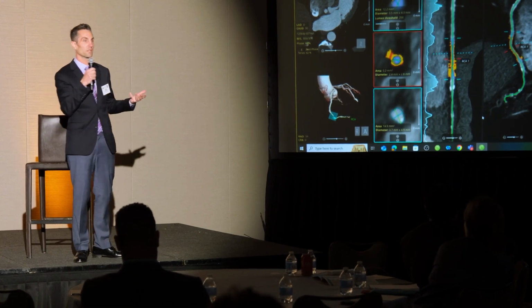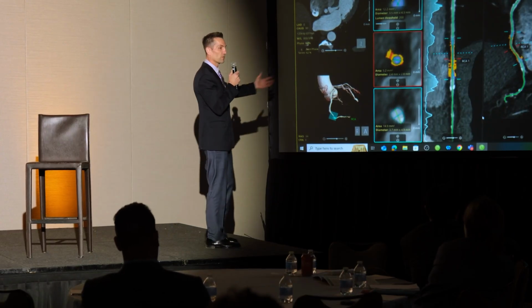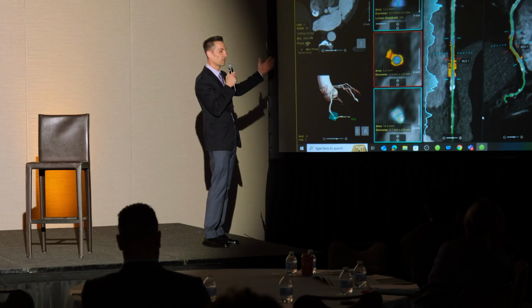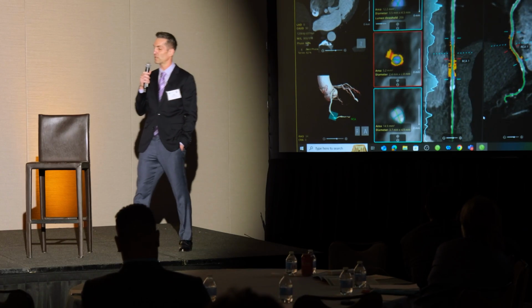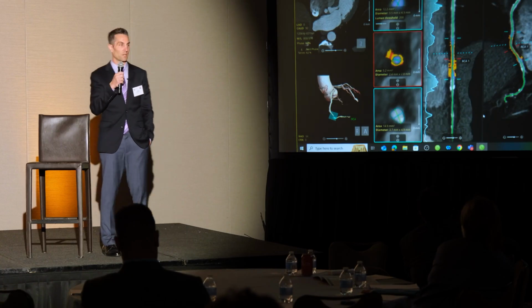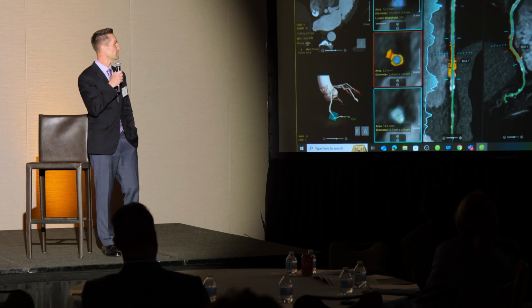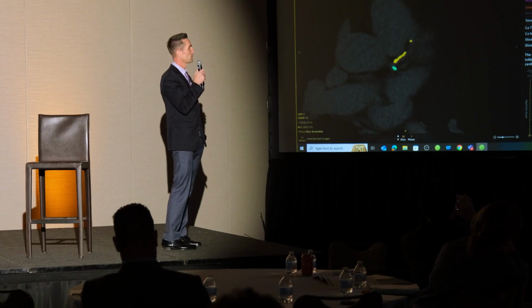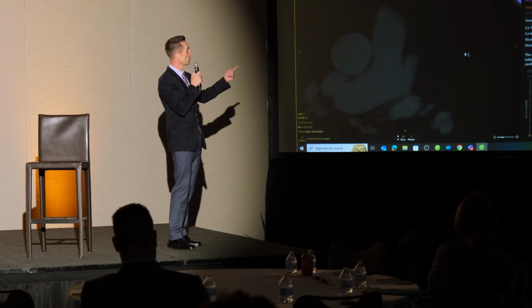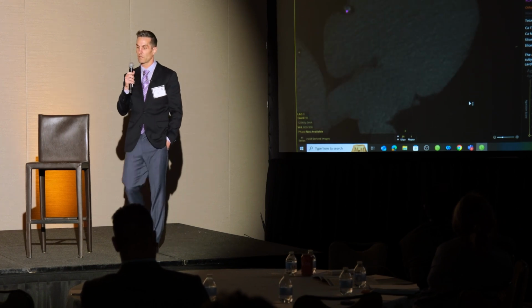So a lot of these things are also, whether it's the 3D tree or the curved planar reformations, and then the actual evaluation of the cardiac examination. Patrick, do we have a calcium score we can also look at? So this is another part of it, the calcium score that you can see is all automatically done and tracked.